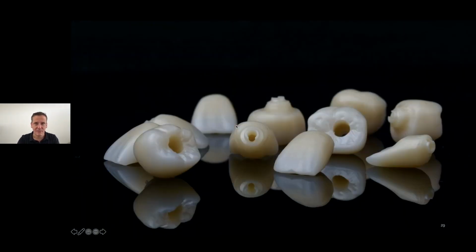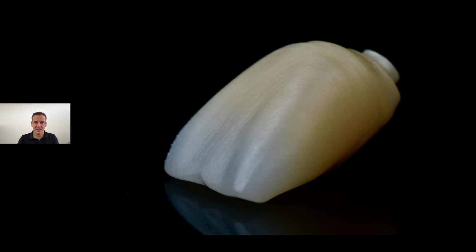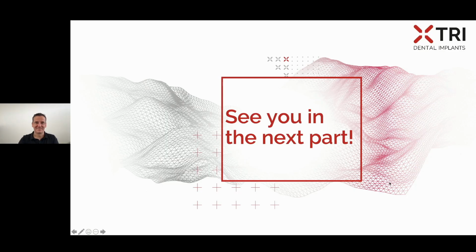I think here pictures can tell more than words. You can see here perfectly ground, milled with these so-called milling strategies in certified milling laboratories. This is, I think, perfection just after sintering of a matrix prosthetic.